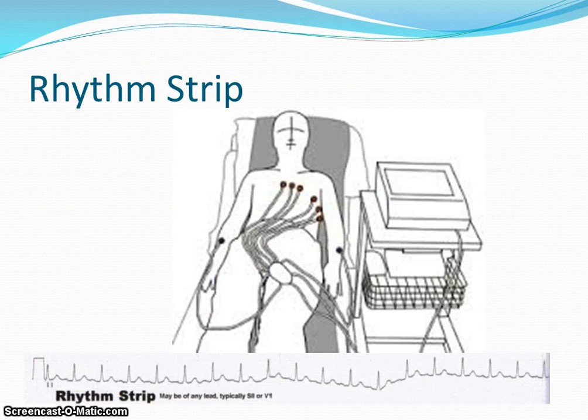The rhythm strip represents voltage against time and allows the diagnosis of normal or abnormal heart rhythms or arrhythmias. The common 12-lead ECG has 10 seconds worth of a rhythm strip. Typically, lead 2 is used for the assessment of heart rhythms, but V1 is a good indicator of atrial rhythms. Atrial rhythms may interfere with the morphologies of the QRS complex, ST segment, and T waves. Ventricular rhythms may produce retrograde P waves and interfere with ST segments and T waves.